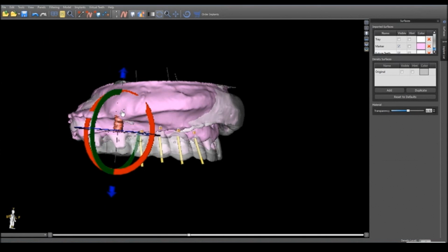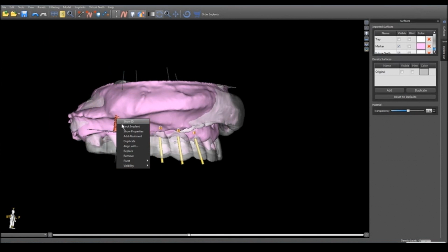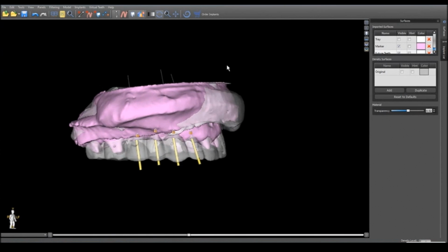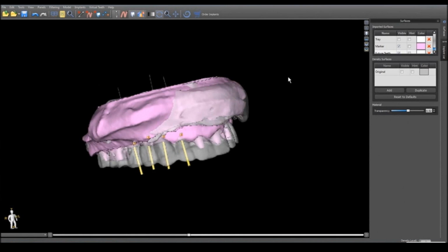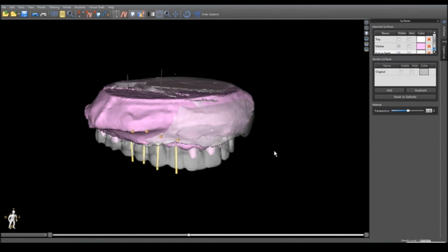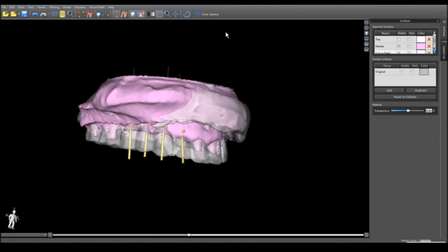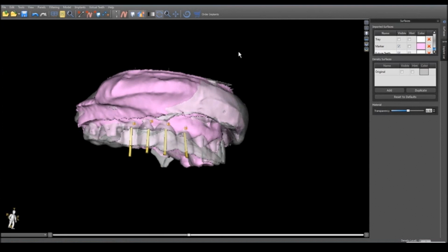I put an abutment on it and rotated it and lined it up with the center of each tooth. And once I had this one in, I duplicated it, and I lined it up with the center of the next tooth. And the same thing going on down the line so that each implant is in the center of the tooth. I had no idea how this would shake out with the bone, but I placed it.